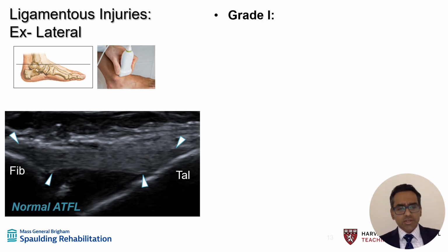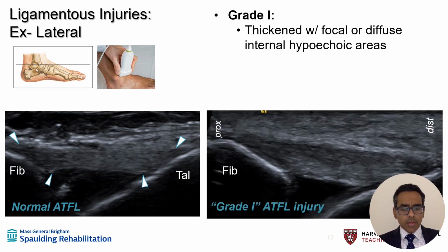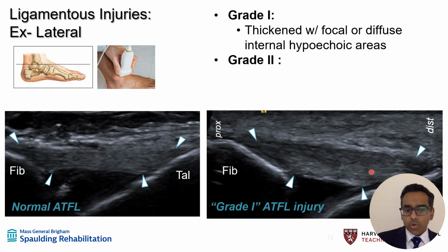So like I said, here's that normal ATFL. When you see a typical grade 1 injury, compare these two together. Notice how much thicker this ATFL is, in a more diffuse area. That's classic for a stretch type injury, or a grade 1 injury.